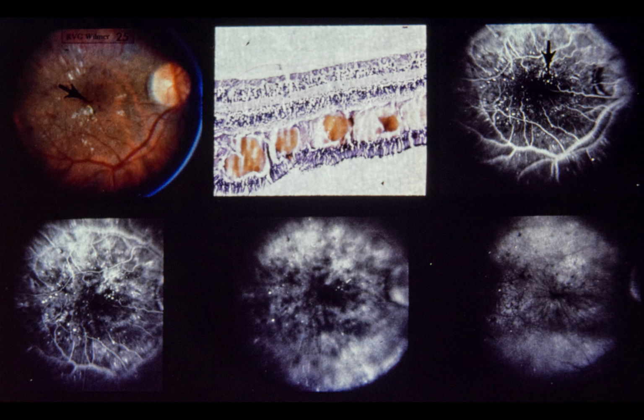Cystoid pattern is not seen in this 1 minute photograph. Lower center, 5 minutes after injection, note further dye leakage at posterior pole, now developing early cystoid pattern. Lower right, 30 minutes after dye injection, note additional dye leakage and well-developed cystoid macular edema.